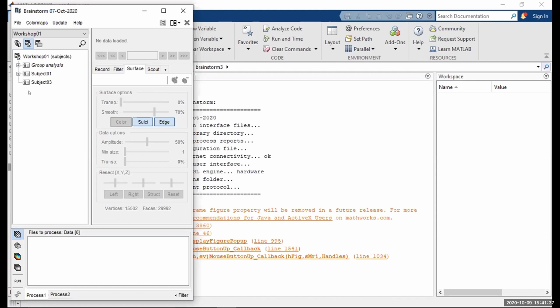So obviously the first step that we would take would be to import your original raw recordings. And so what you will do in this case, I just press the functional data view here. Let me first work on this new subject that I created, and afterwards we can have a look at the subject that I created previously, just to save time and not actually do any computation today.